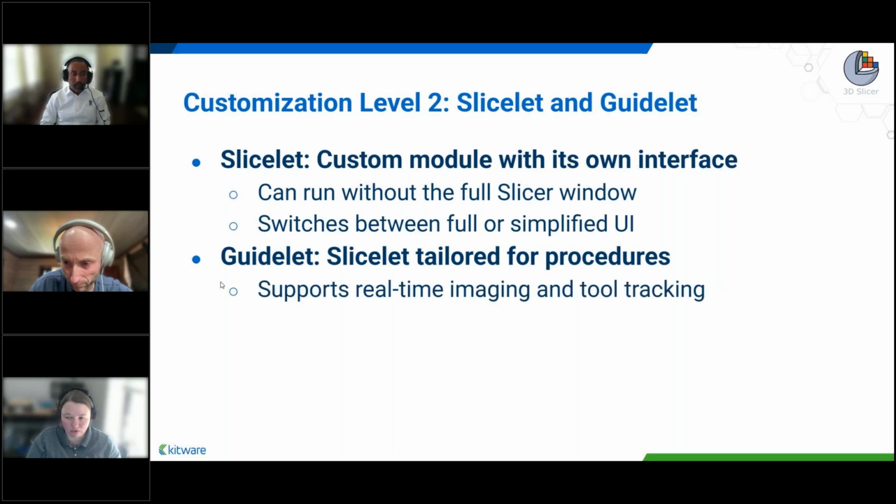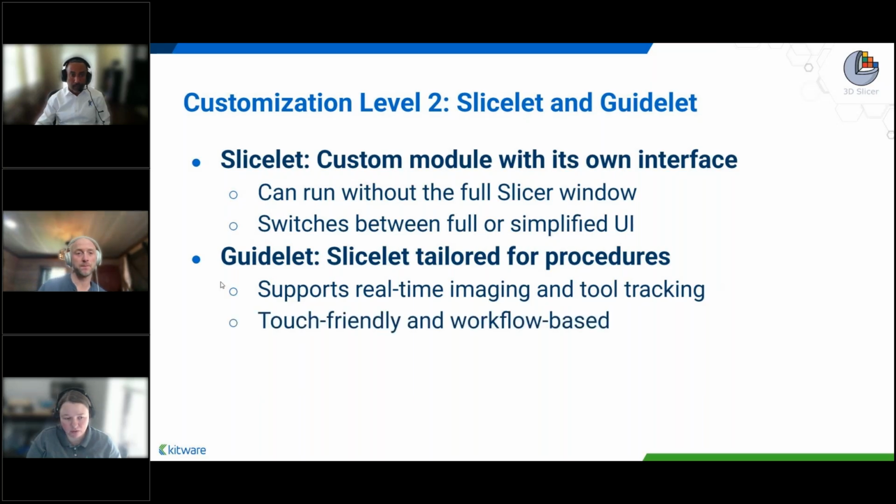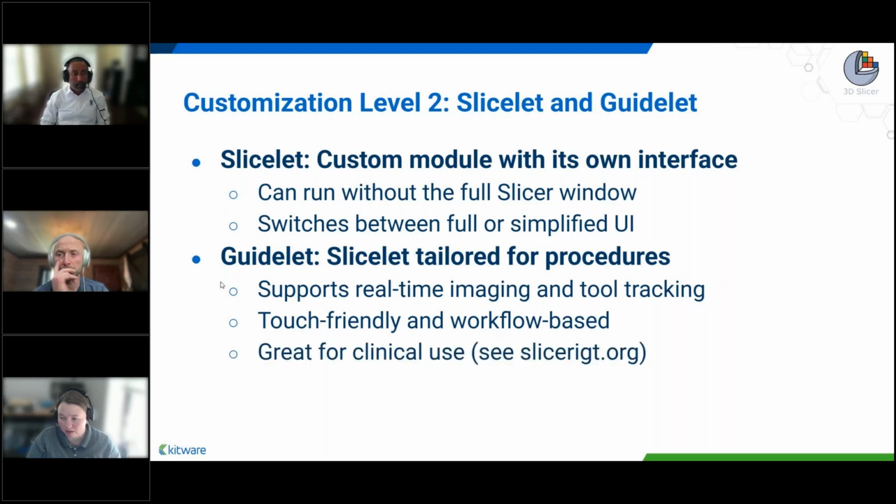They can support real-time imaging and tool tracking through the Slicer IGT extensions. With a reworked UI, they can be very touch-friendly and workflow-based. We often see these being placed onto tablet computers to be used in the OR, and they're great for clinical use as they leverage Slicer IGT.